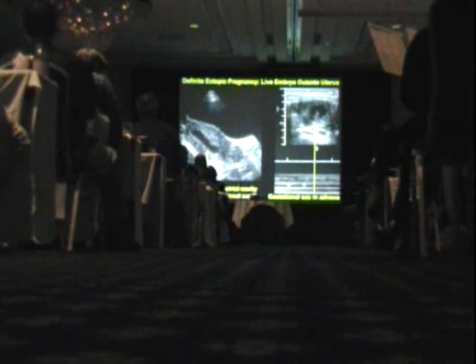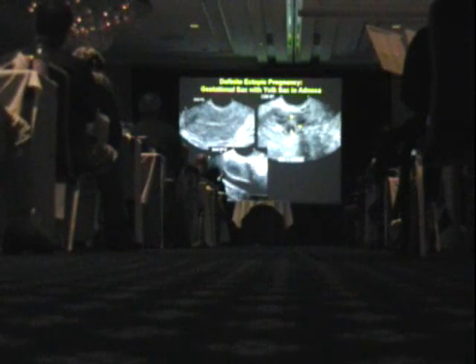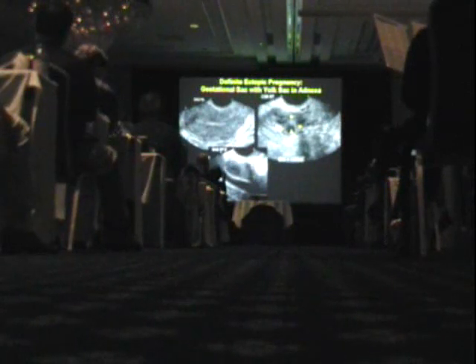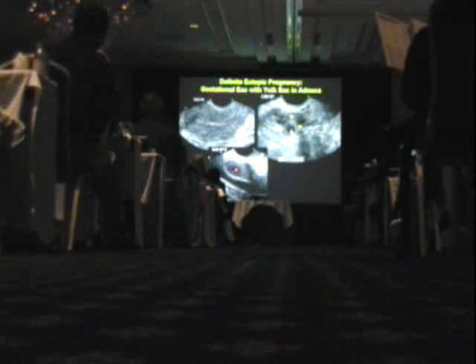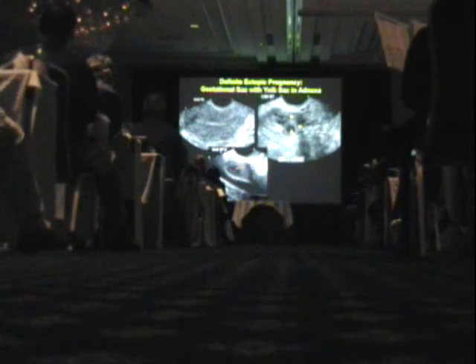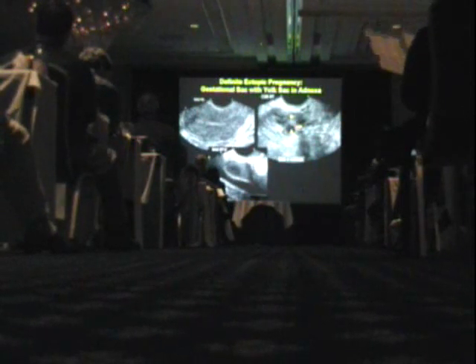There's fluid in the endometrial cavity, sometimes termed a pseudo-gestational sac. It's not a gestational sac, it doesn't have any of the characteristics, and moreover, there's a pregnancy outside the uterus. Again, nothing in the uterus. In the ovary, there's this hypoechoic mass, but that's irrelevant, that's corpus luteum. But importantly, out here in the adnexa, there is a gestational sac.